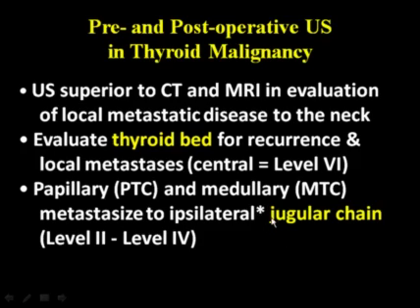And I put a little asterisk here just to remind you that when you're scanning these patients, their thyroid gland has already been removed. And I would say that most patients do not remember which side their thyroid malignancy was on prior to having the thyroid gland removed. In addition, there's a small percentage of patients, reported cases in the literature, which discuss contralateral metastases in thyroid cancer to the opposite jugular chain.